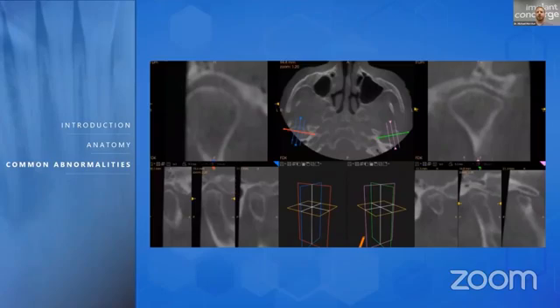And you can see that there's remodeling, there's flattening, and at this point, because we don't see a large amount of osteophyte formation, and we're also not seeing any subchondral cysts, you're going to start considering that this is old remodeling and currently does not have an active process to it. So now it's something that has discontinued. So still putting the patient in a mouth guard at this point is just going to maybe relieve pain and not necessarily reverse this process.